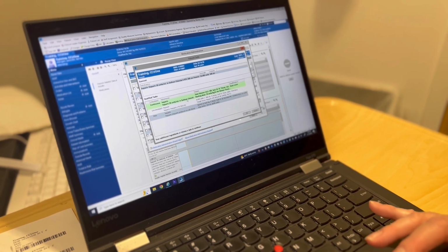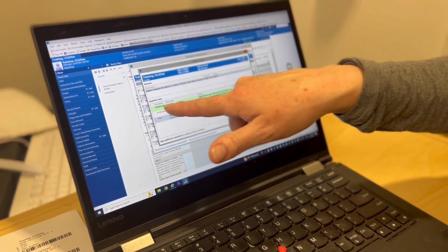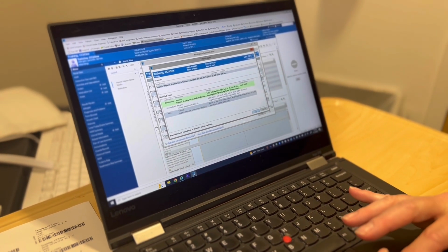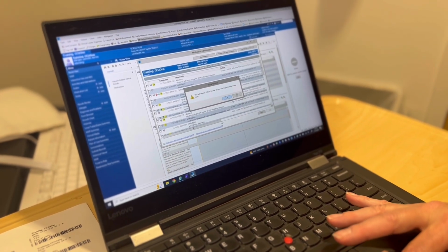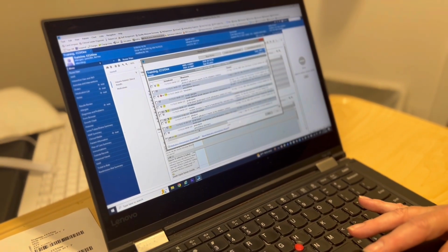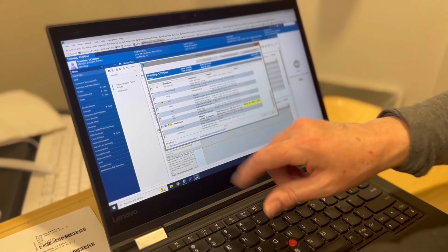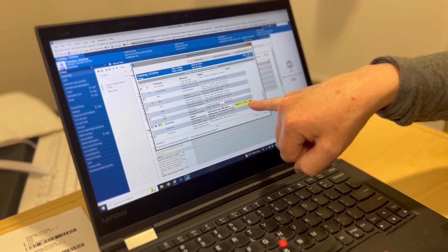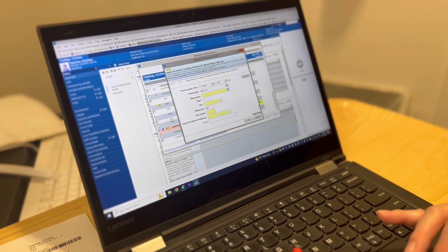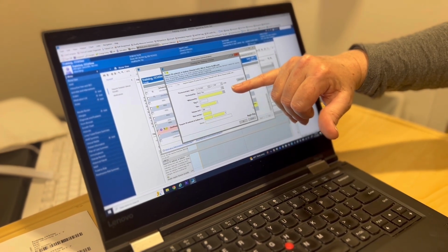What I've scanned and bolded right here is my continuous. So I'm going to say yes, that's what I'm going to start with. I'm going to do my nurse review. Now, once I've scanned it and I said that's what it is, notice my yellow box comes up. So I'm going to click my yellow box. And notice I have a witness here.